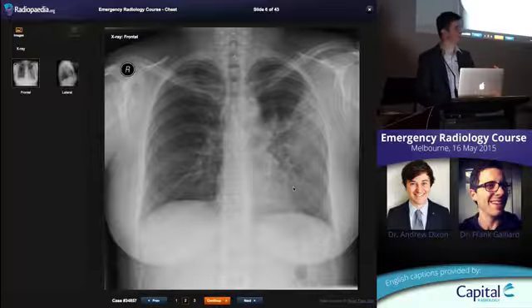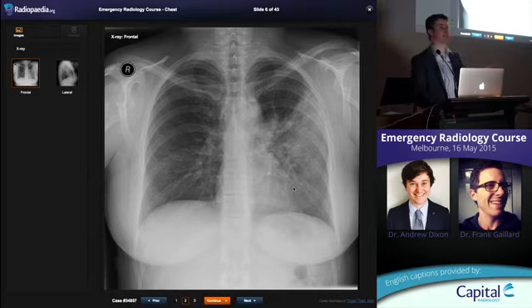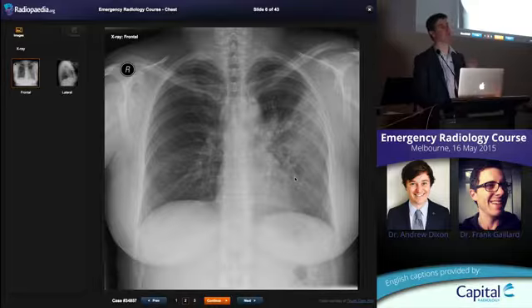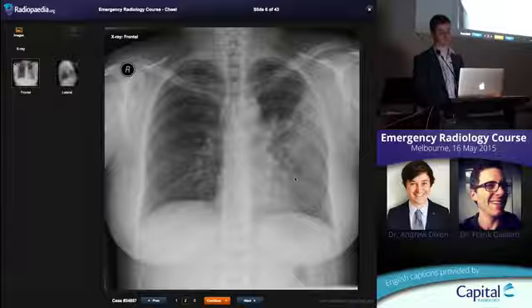The heart is at the front and it has the left upper lobe lingula sitting next to it, okay? If this was in the lower lobe, you'd be able to see that heart border perfectly clearly, because they're not directly touching each other. This consolidation must be directly touching the left heart border, therefore it must be within the left upper lobe. That's the silhouette sign or the loss of the normal silhouette.